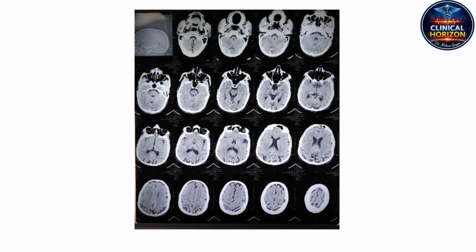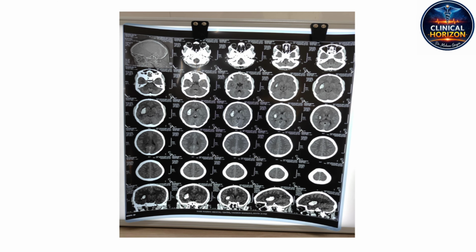So what happens when that perfect symmetry shatters? Moving to scan 2, our next demonstration. The baseline here is completely disrupted. Such a dramatic shift. It really is. We're looking at a localized, sharply defined hyperdense lesion deep within the right basal ganglia. And notice the edges. Immediately surrounding this hyperdensity is a distinct hypodense halo. It clearly indicates perihematomal edema. That is a textbook acute intracerebral hemorrhage.